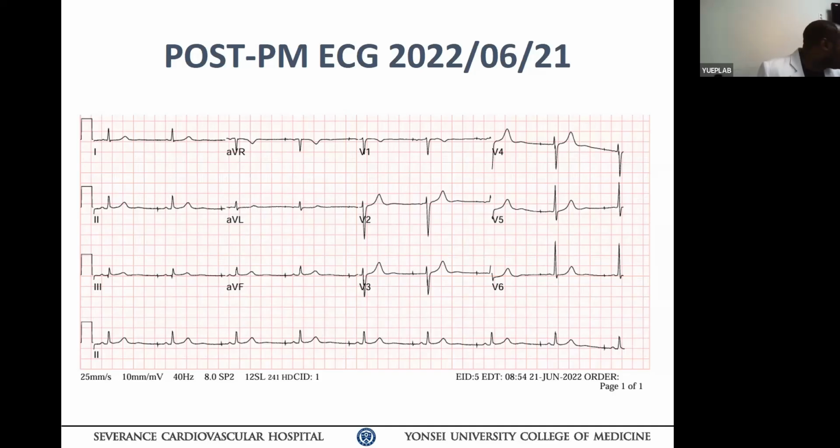So I tell them, get an EKG. You can see clearly that the patient had an exit block. The spike is here, but local activation is about an 80 millisecond delay. Then if you have a programmed delay of 80 milliseconds, you're hitting the same place. That doesn't make it any better. So it is an important concept when you follow the pacemaker. Especially when you implant an LV lead on the left side, let's say in a cardiac vein, you had better get a real EP tracing, not just rely on what the rep guy tells you, oh, it's a capture, blah, blah. That doesn't make any sense to us. It's a very important concept.